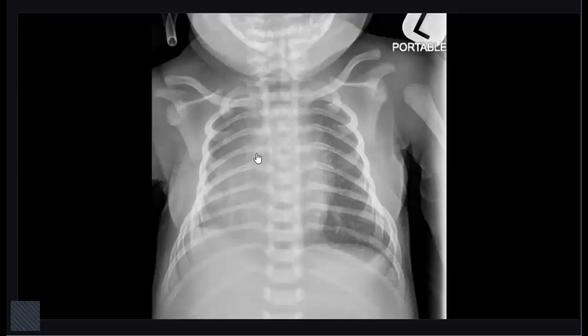There is no rib fracture seen. No bony pathology is seen. No pneumothorax is seen. No lines and tubes are seen. So the opacification in the right hemithorax with pleural effusion on the right side. These findings likely represent infective etiology with pneumonic consolidation with parapneumonic effusion.